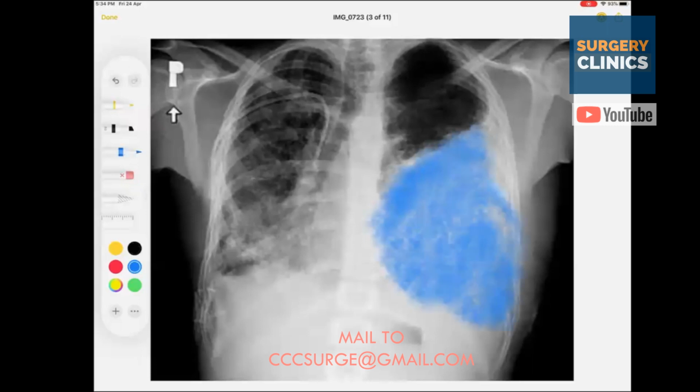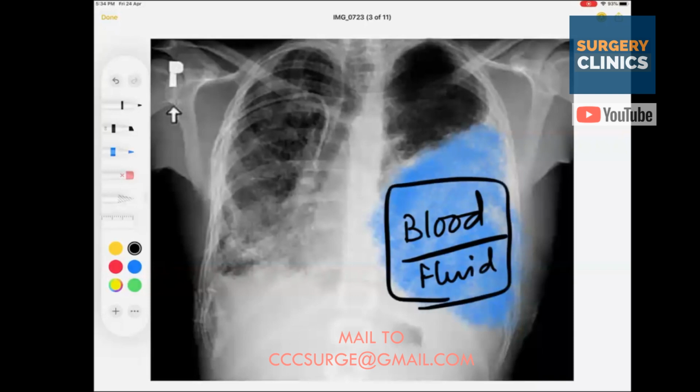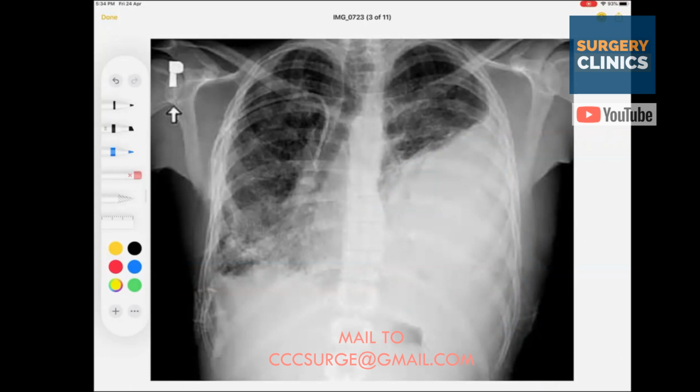Why is it white? What did I teach you now? Sir, I taught you that this is blood, okay, or fluid. So it depends upon the scenario, but definitely this is not normal. So that means if you remember this one, that if this is the lung and this is the blood, that means this patient must have had something really bad, okay? And if this is A, oh, by the way, I really forgot.